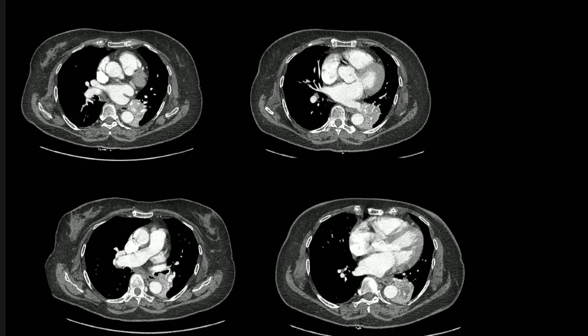Your findings are absolutely right, and honestly, you have clinched the right diagnosis. I just want you to explain what you are seeing. Sir, I'm not able to think any further. How I would report is that there is an enhancing mass in the most expected position of the left lower lobe, posterior medial basal segment, which has resulted in the collapse.